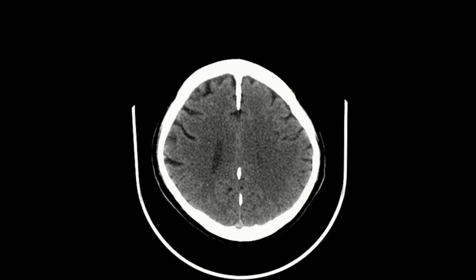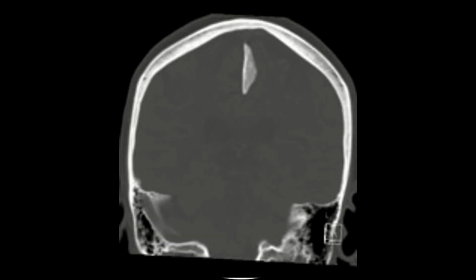Right, so this is a splendid image depicting the evident calcification of the falx cerebri. So in the midline, we have this dense white structure which can easily be mistaken for an intracerebral hemorrhage. So here again, the brain and bone window paradigm plays an important role. So this same structure in bone window would appear something like this. So it's quite evident that it's some form of calcification because blood is not this dense in a bone window.